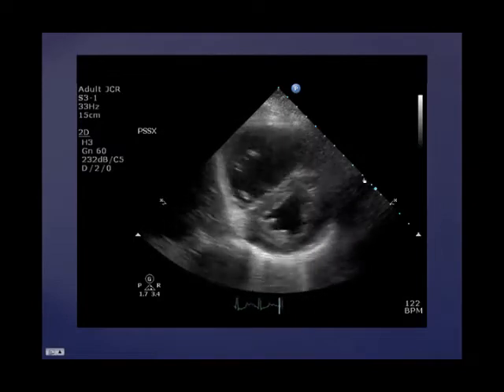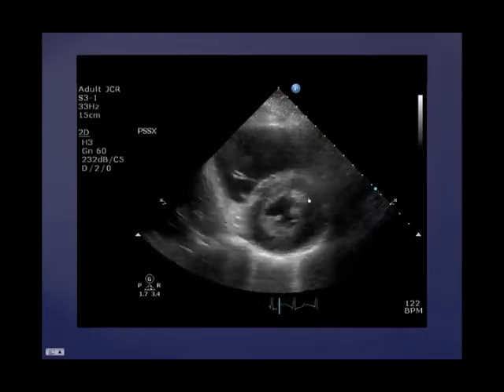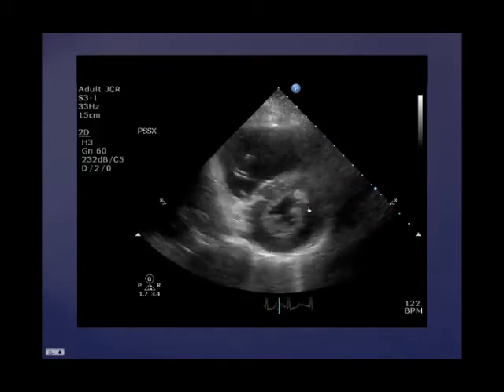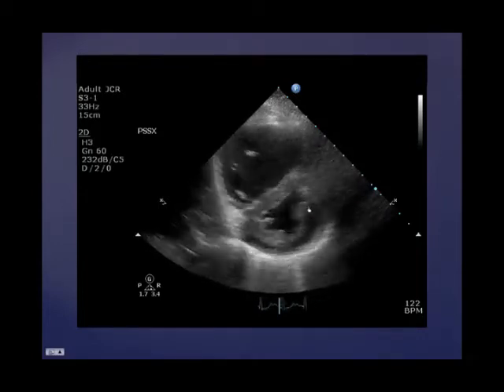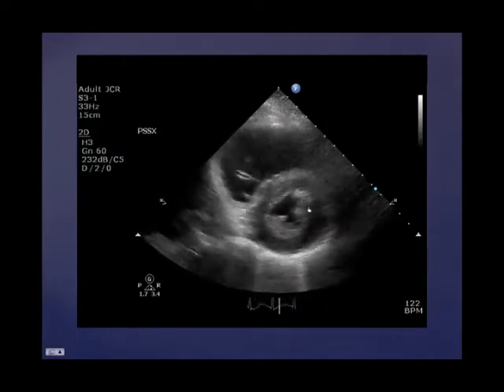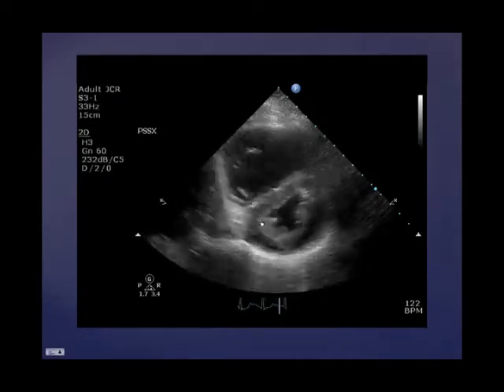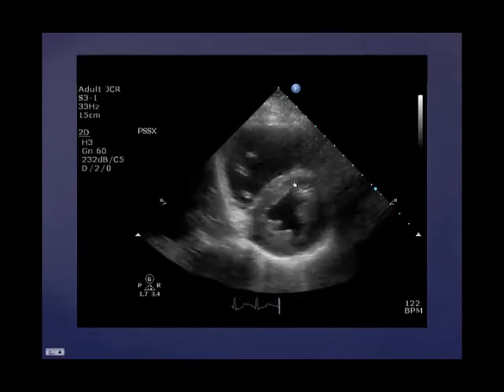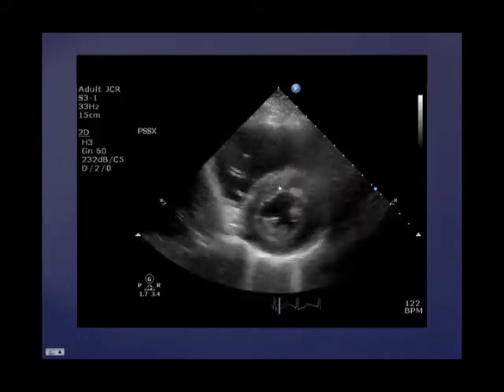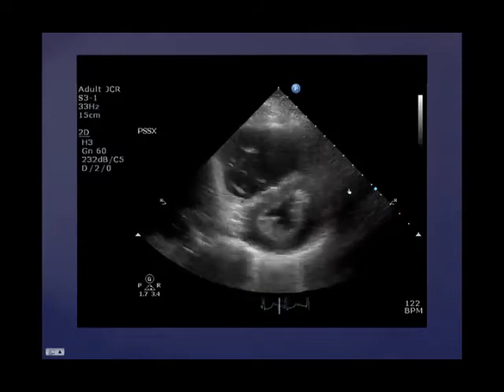The other thing that I think is really important is that with systole, watch this bit here and watch it go in. Watch when it goes in. So it's going in. When this bit goes in here, or in fact all of the non-interventricular septum contracts in systole, this bit actually goes out. Okay, and that's called paradoxical septal motion.